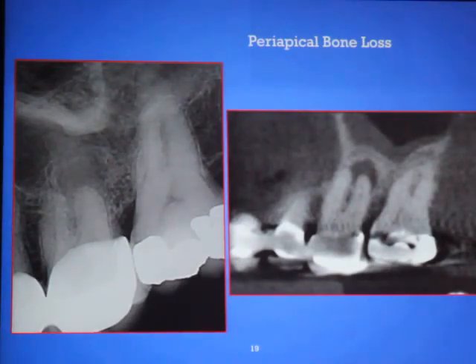And again, this is just the one slice that I have put here for the presentation. In reality, you can see many slices in different angles and get an understanding of what the exact size of the lesion is and how many roots are involved with the periapical pathology.